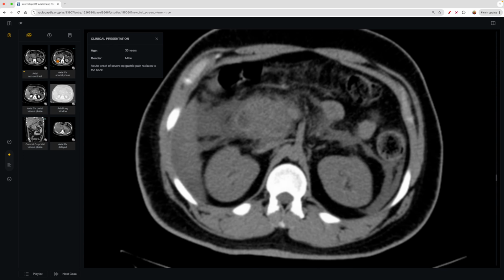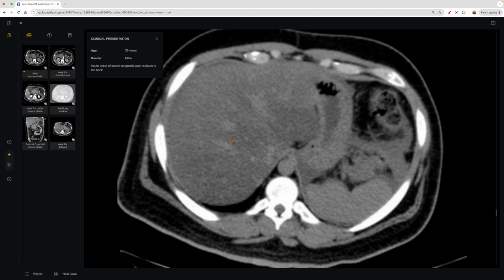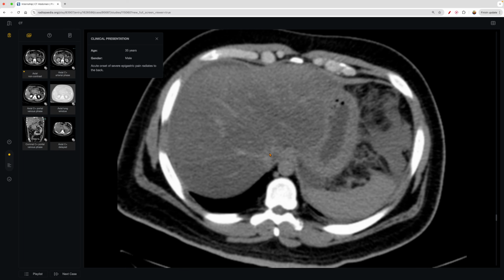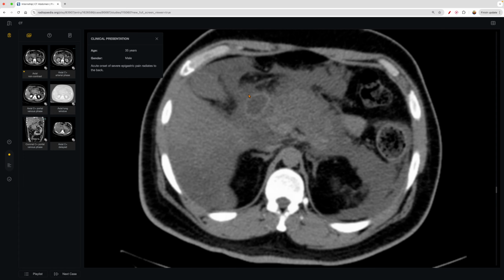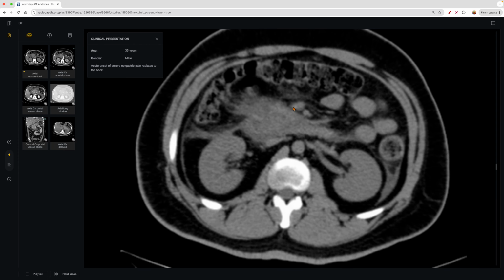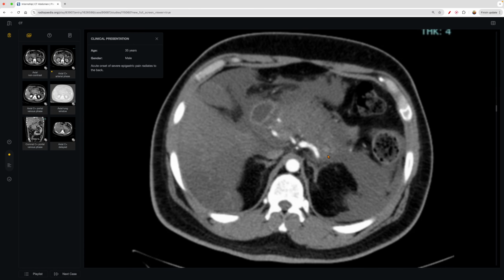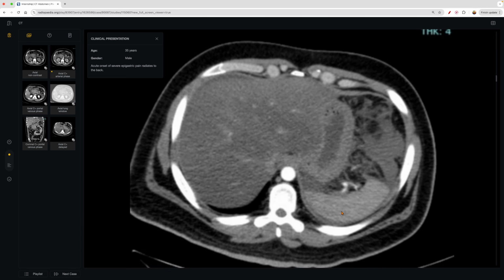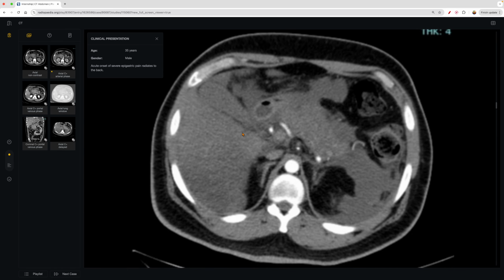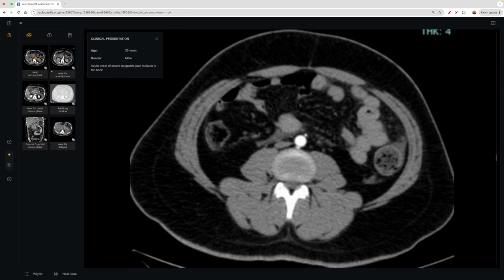And so let's see here if this would be useful to show. Okay, I want to show this without the contrast here, right? It's a little bit difficult to appreciate the structures. Everything kind of seems like a gray mess. It's not too exciting in terms of appreciating the anatomy. But then once we give some contrast, this will be arterial phase, so perhaps not the greatest example, but you can certainly see the structures a bit better. The spleen's more visible, the vasculature within the liver, the kidneys are certainly more visible, the intestines kind of pop out a bit better. And that's the perks of utilizing contrast.